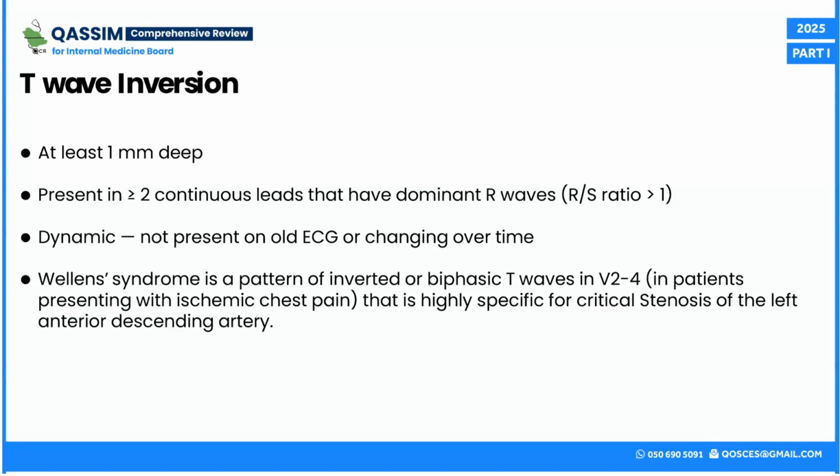So any patient that presents with a heart rate above 100, we need to sort them out. Do they have a narrow QRS, which is less than 3 small squares, less than 0.12, or a wide QRS? If so, are they regular or irregular? Is the distance between every RR fixed? If it is, then we know our differential diagnosis, and this could help us in the management.